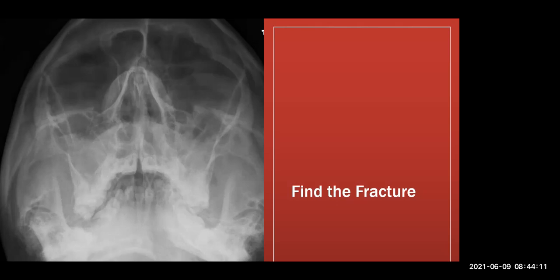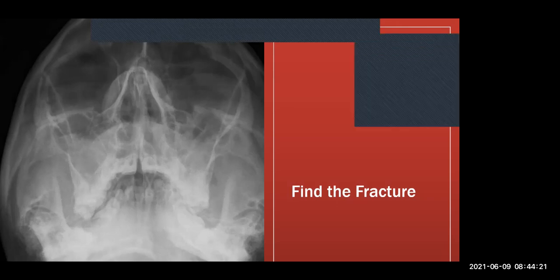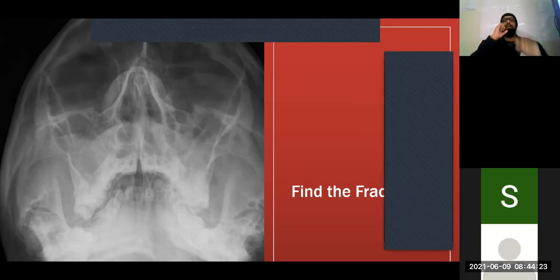So what's happened to this patient's face? If you look at this, you can see they've got a fracture there and a fracture there, and we can see that everything's sort of pushed down. Here we can even see a nasal fracture there. So what's happened to their face? This entire portion of the face is basically pushed back.